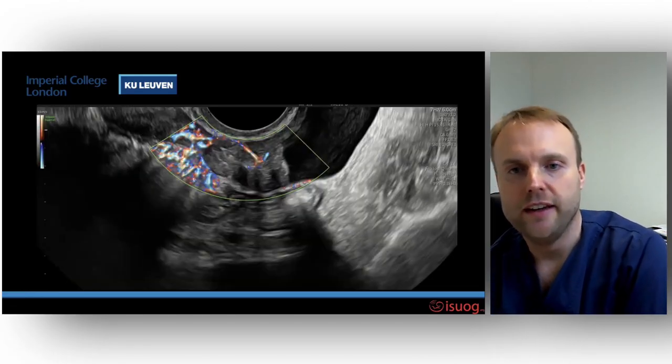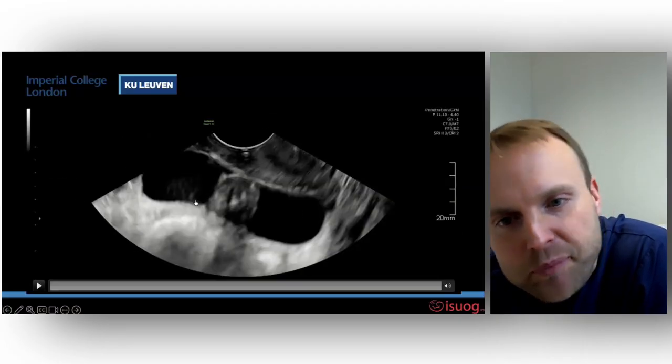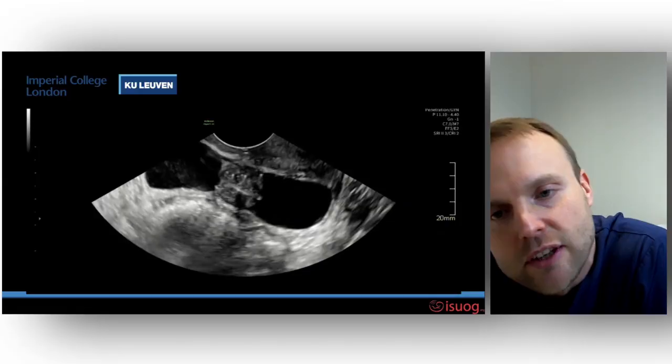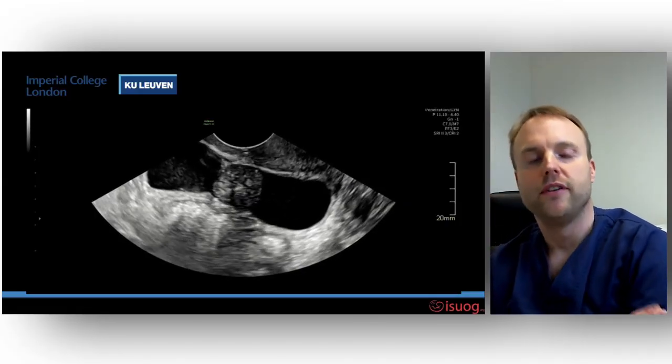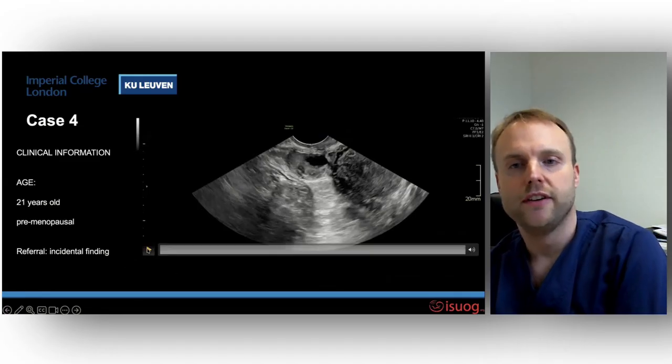I just have to see again, Nina, if you have more videos, to see if we have a septum inside or not. So here, maybe this first video. It seems like we have two separate cystic areas inside and a solid component, so a multilocular solid lesion.